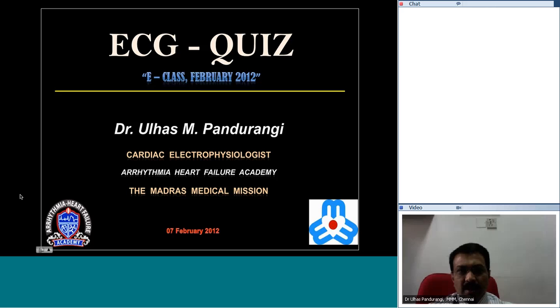All right, so today's e-class session is on an ECG quiz based on the ECGs which we have already learned in the previous e-class sessions. Essentially, the quiz is going to be a discussion on the traces pertaining to pediatric arrhythmia as well as some of the basics of pediatric electrocardiology. So let's start with the first of the ECGs in this e-quiz session.